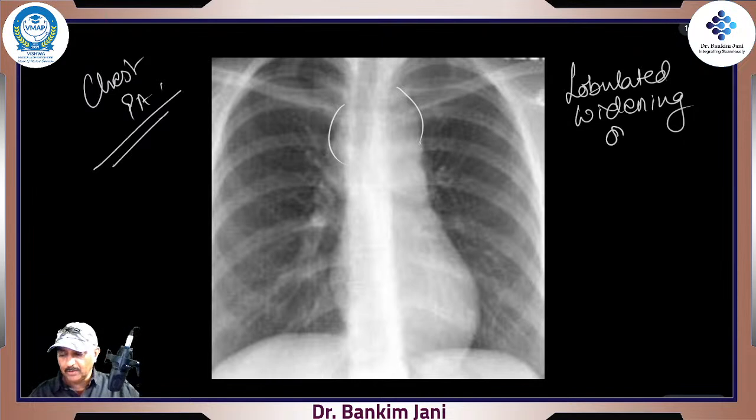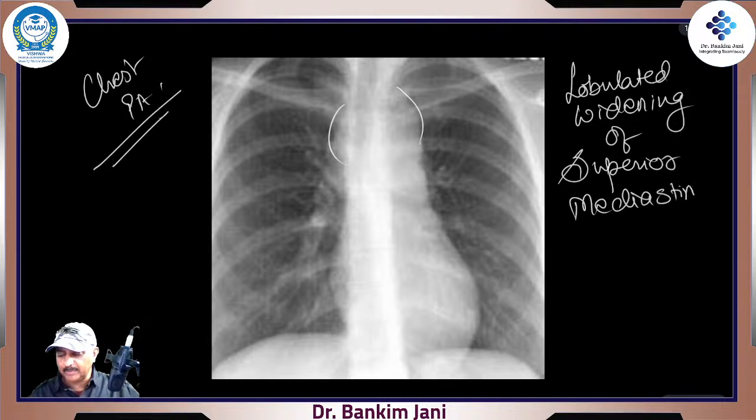Lobulated widening of the superior mediastinum. Nothing more can be said about it. We can just guess that there is definitely some space occupying lesion. So in order to see this thing, we have to take a lateral view. So we go for the same patient.